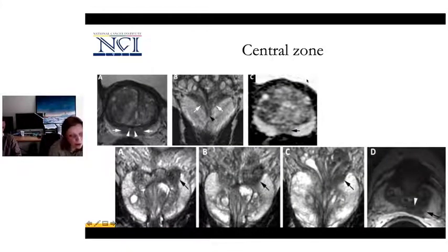For example, here you see the central zone. It's in the base of the gland. And if you remember prostate anatomy, here there are ejaculatory ducts going through the prostate, going through this zone, and around them we usually have fibrosis, which gives us such a dark sign. And sometimes, if we don't know about this, it could be rather suspicious, especially when it's asymmetric.